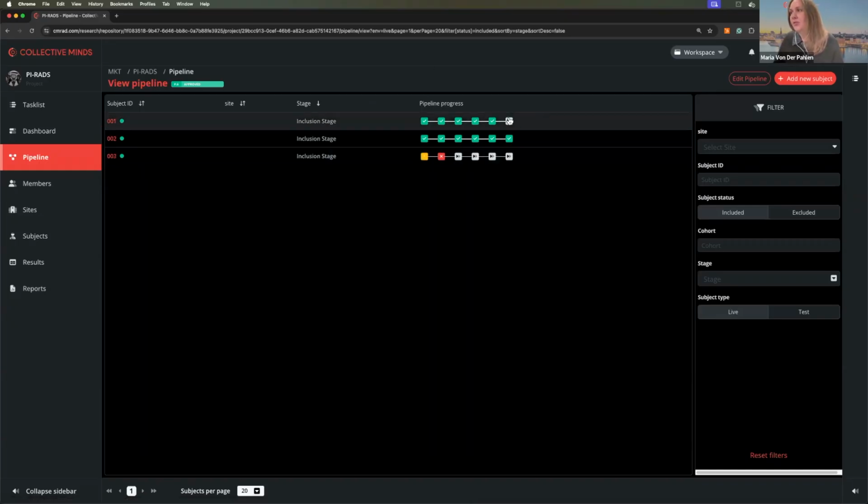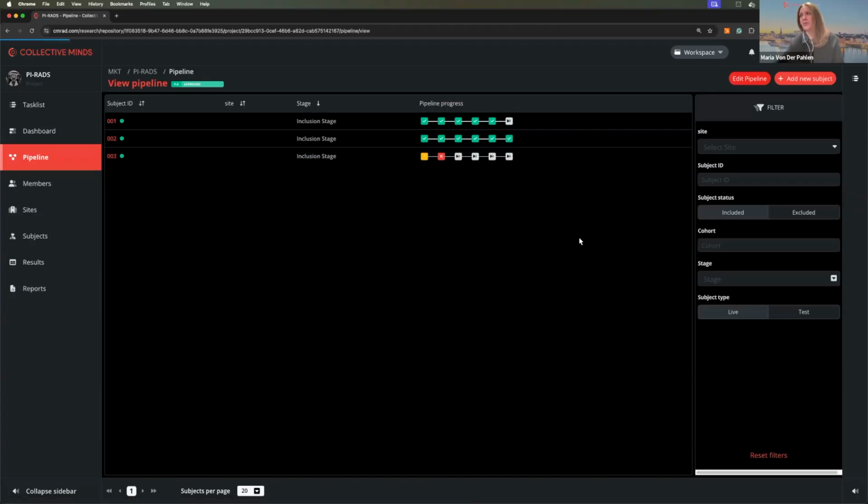Now, in my screening report, which is the new feature, I want to include the data from reader 1, reader 2, and reader 3 to create a report that instantly can go out to the receivers I choose in the project. So let's go backstage and see how it looks when you set this up in your pipeline. So I will go to Edit Pipeline to have a deeper look.